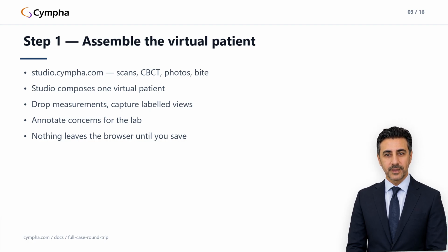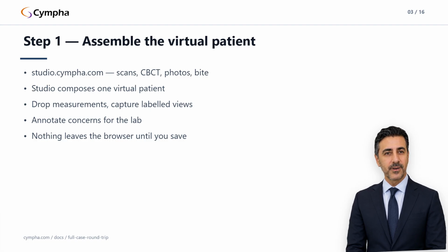Studio is a single user planning surface right up until you save. Nothing is shared, nothing is submitted, nobody at the lab can see any of it. That changes with the very next click. Step 2 is the first handoff.